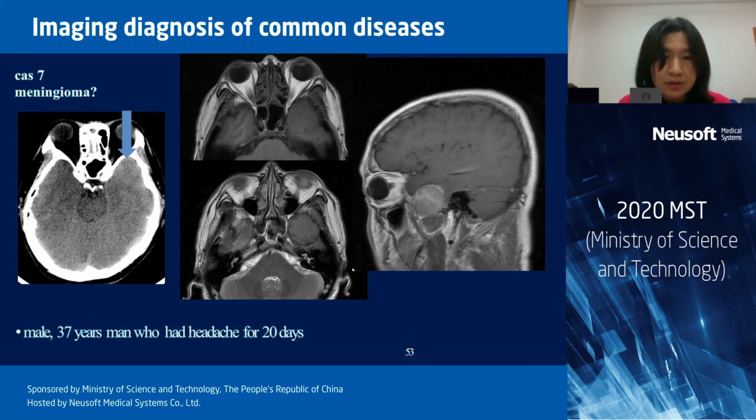Case 7. Is the patient with meningioma? The mass had no calcification and surrounding edema. It had isointensity to gray matter on T1 and T2 weighted imaging. In contrast MRI, the lesion didn't have homogeneous enhancement, but like half-ring enhancement. The mass was an extra-axial lesion. The pathology was inflammatory pseudotumor. It was difficult to distinguish from meningioma.